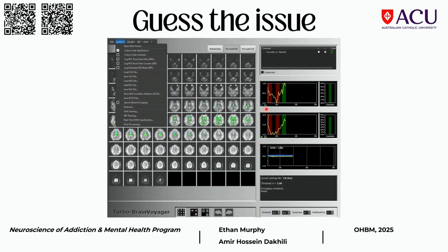So again, this is something where you have your whole neurofeedback run up and running. Everything is in communication with each other. Everything is correct. You've localized your ROI. You've correctly selected your two VOIs. The DICOM series number is correct. Your target folders are correct. Your feedback folder is correct. But you forgot to check a box, and you're not getting any feedback value scores. So yeah.